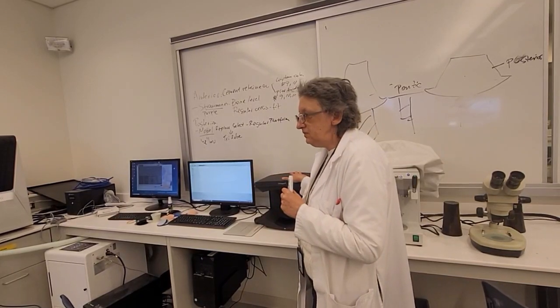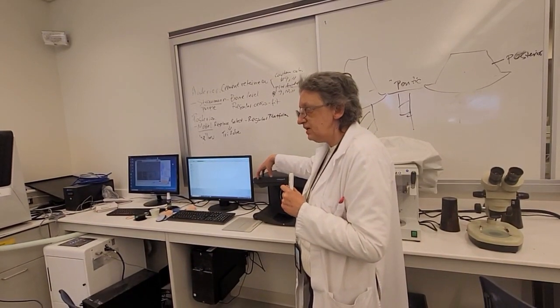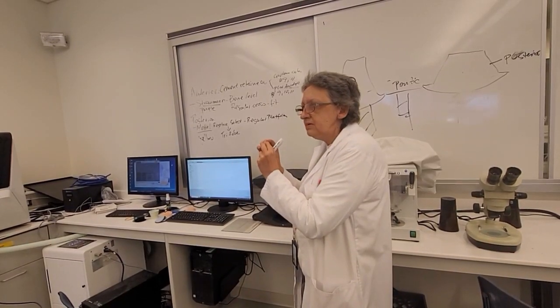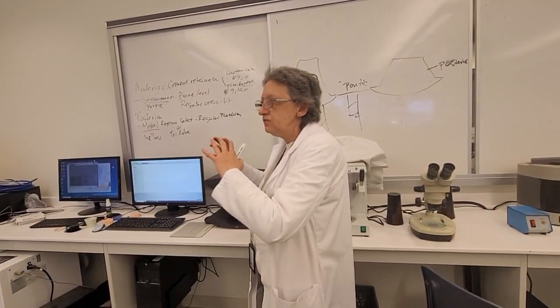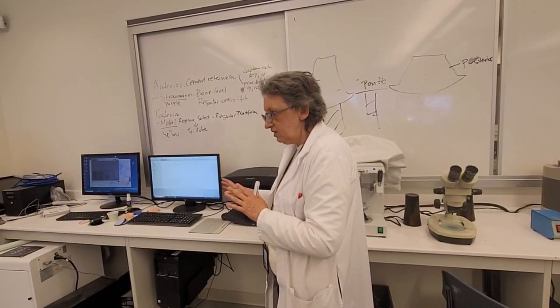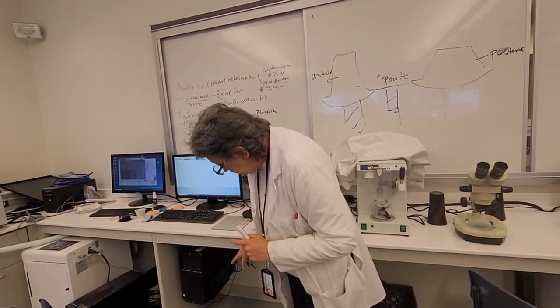This scanner, even though it's an older version, has 3 cameras inside, and it's going to move the model and take multiple hundreds of thousands of little pictures, and at the end the software is going to put it all together to create the image that we're going to work with, okay? So for this to work, we need that.